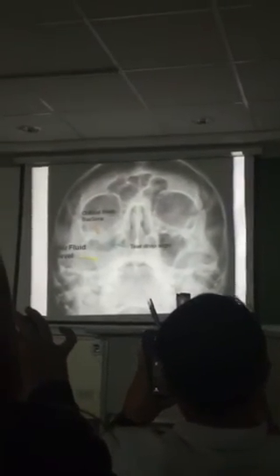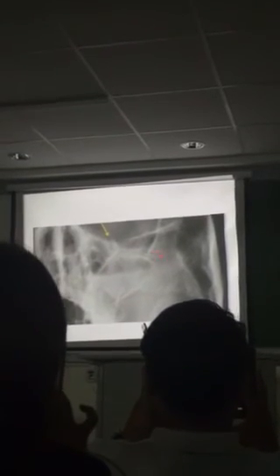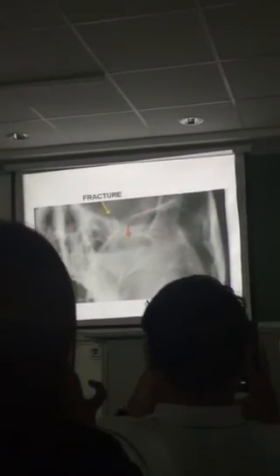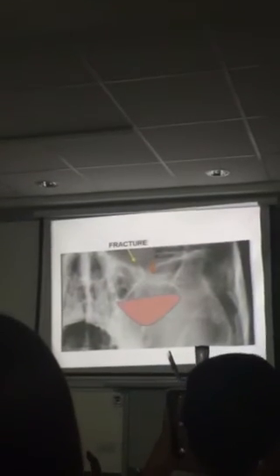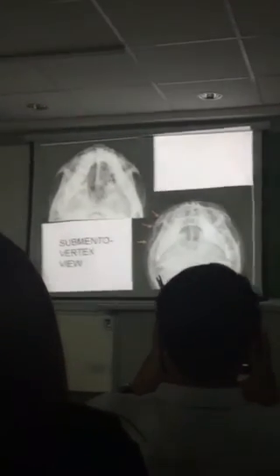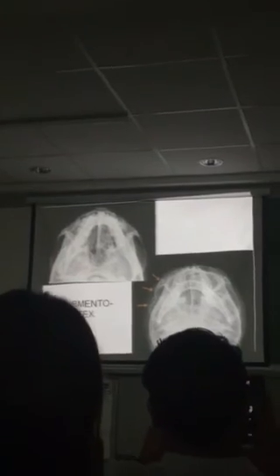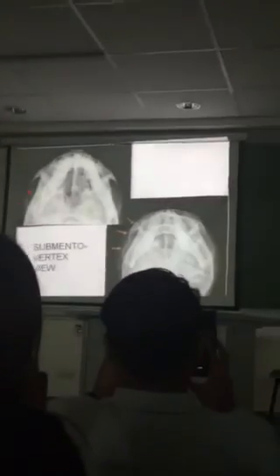Specifically, what view? Waters, right? Because it focuses here. Air fluid level. Infraorbital fracture. Submentovertex view. So this is the normal zygomatic arch.